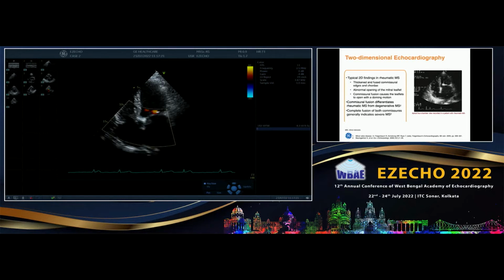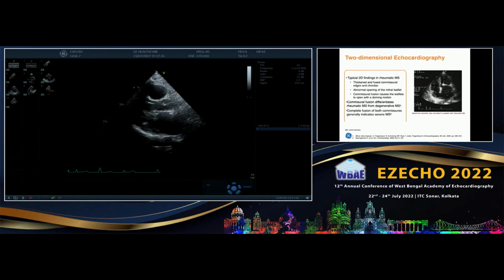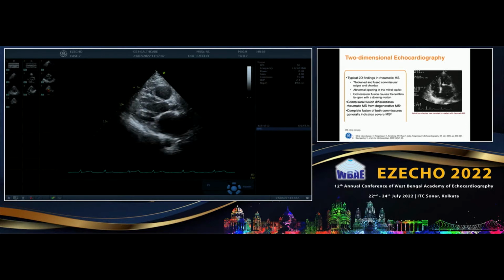That is how it's a simple way of investigation. It's very interesting. Doing a clinical examination and echocardiography is exactly akin to doing Sherlock Holmes work. You are putting the pieces together and getting an explanation for everything. So that is why the RV is dysfunctional, the LV is dysfunctional and dilated, and there is also severe TR. What would have happened otherwise, if you are not thinking that way, is that an MR which is not in the standard plane, you can miss.